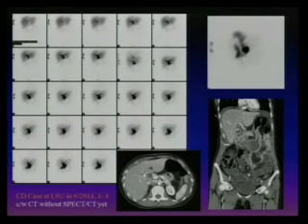So this is a real question. They sit down there and say, you have to tell me where, and based on that I can do something, right? So this one is the right side, going down. You can see it further on the CT. So what's the exact location they come from? Let me see if we have one. So the trick is to run the slices one by one. Look at the first abnormal slice, and then you follow that. You see they become larger and larger, down to the base.